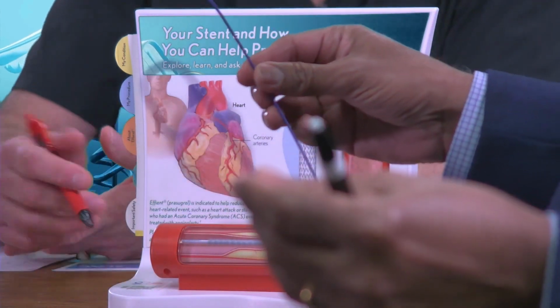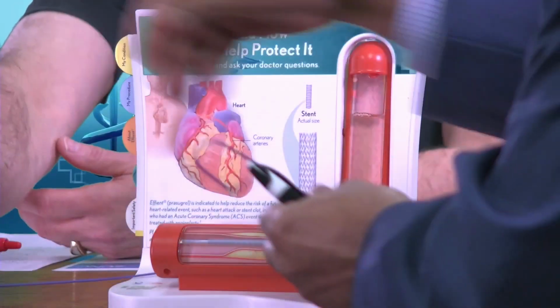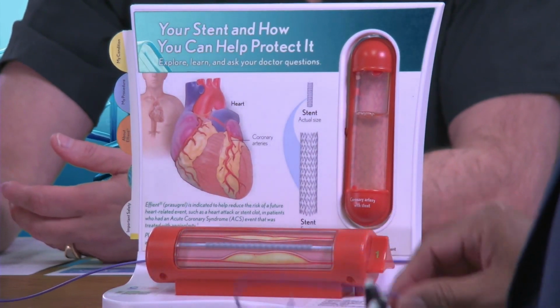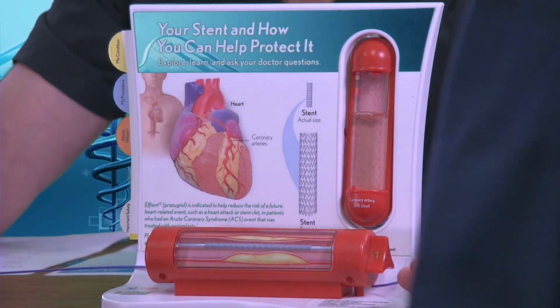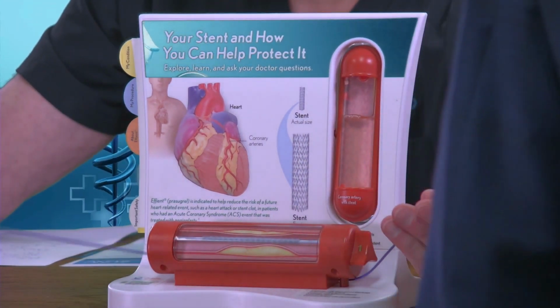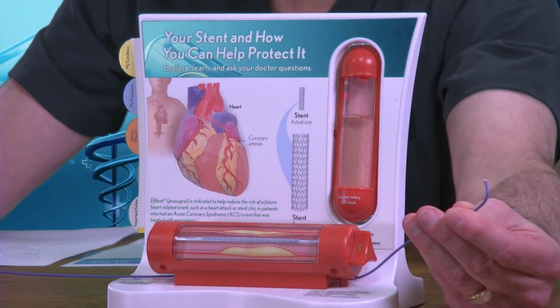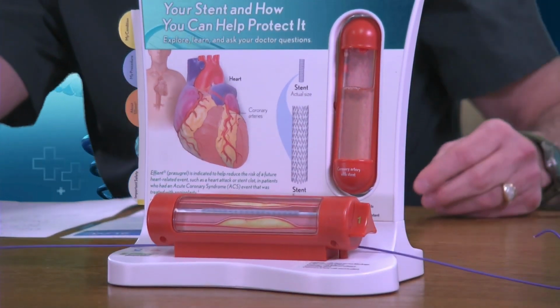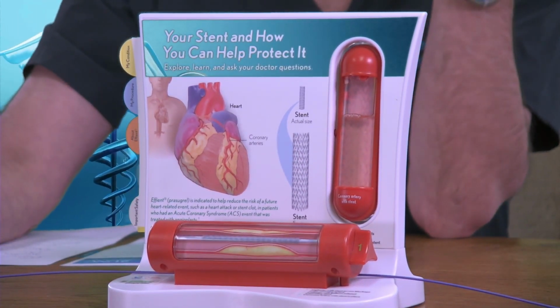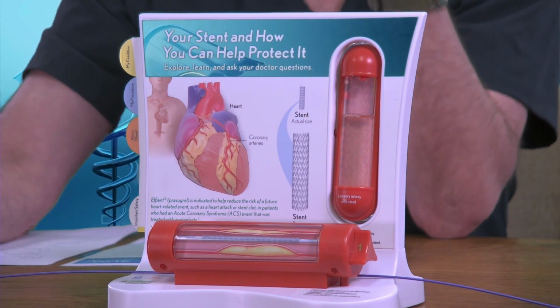This is what we call a catheter. Hold it closer to here so it stays in focus. It's shaped like this depending on which artery we have to engage. Now it goes in unbent like that, of course. The bend is to help us turn corners and everything, correct? And so this will go inside the artery through the wrist or through the groin, right? Yes. And then you track that up into the heart and then into the arteries that supply blood to the heart.